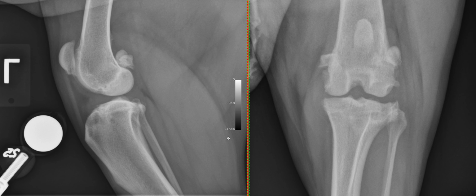When we assess stifles on radiographs, the first thing we are looking for is the presence of joint effusion. So how do we assess this? Well, we first look at this infrapatellar fat pad, which is this radiolucent triangle of fat at the cranial aspect of the joint, and we assess if it's displaced cranially, pushed cranially by soft tissue opacity at the level of the joint space, which is the case here.